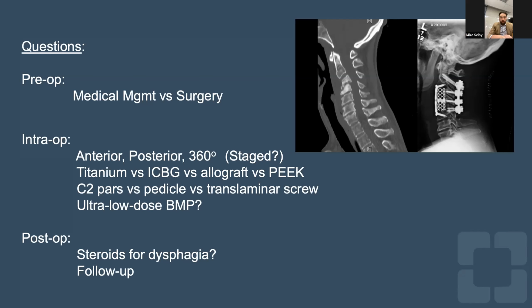And look, when you look at your construct there, I really like the way at the distal level, you guys haven't dissected out that lower facet. You've gone for a flatter lower lateral mass screw. The only other thing sometimes I've done in these situations when I've had navigation, and not that cost should be a major concern, is with your lower screw, if you've got good support at the front, sometimes I do a transarticular screw, so actually go across the facet. It's almost a reverse lateral mass trajectory, and it saves you an implant point, and it keeps you well off that facet at the bottom as well. It's really easy to do under nav.